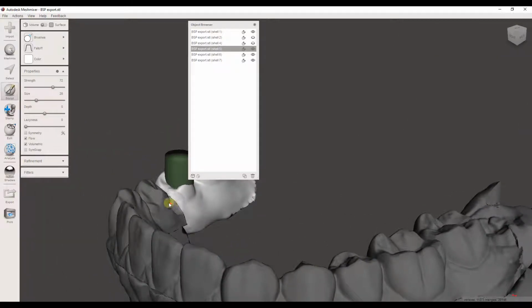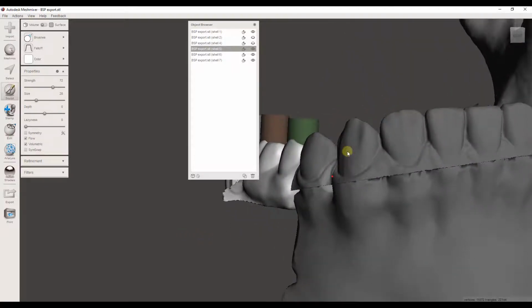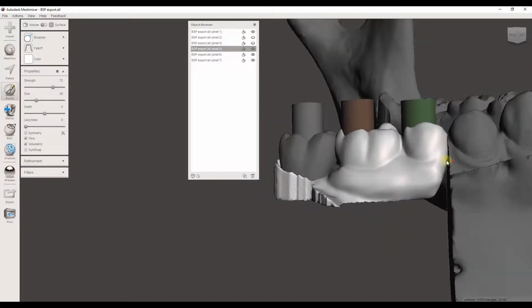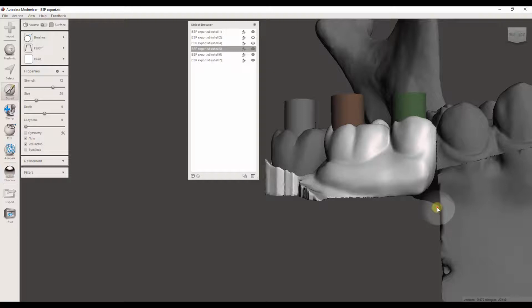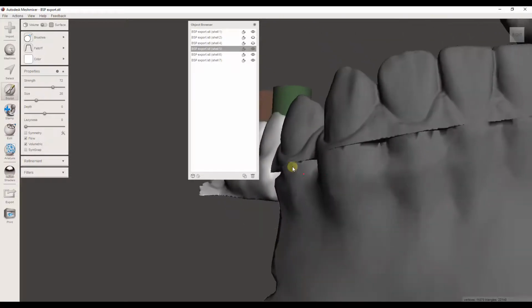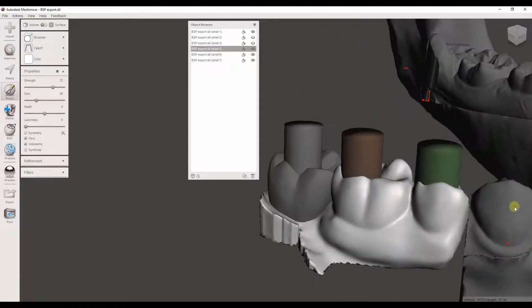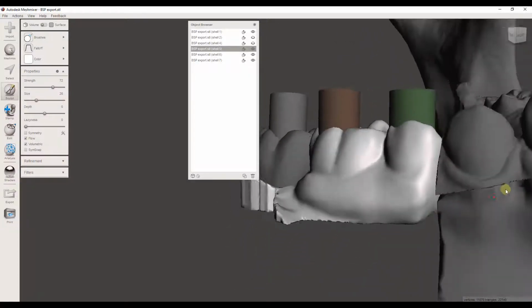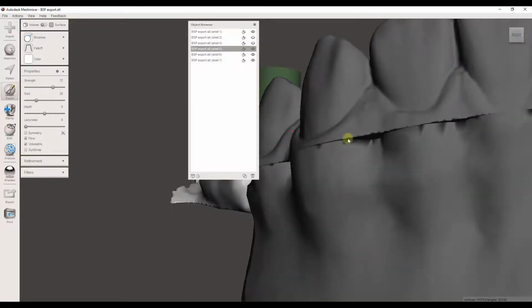And that's why, similarly, I can go kind of through the gray model here and smooth off the contact where I'm pushing it back a little bit. And you want to end up having a small space, and we're getting really close to being about right here.